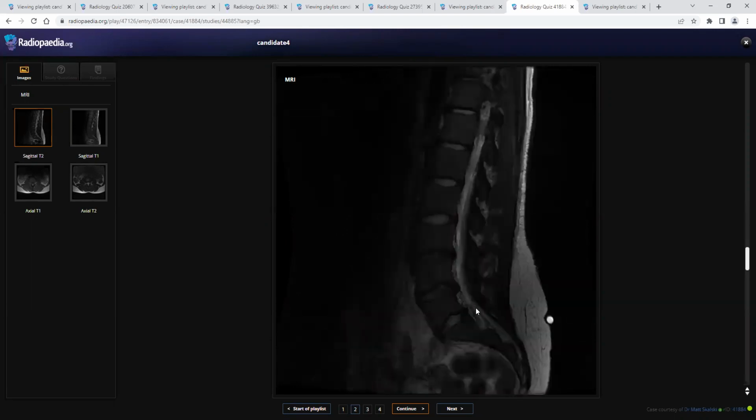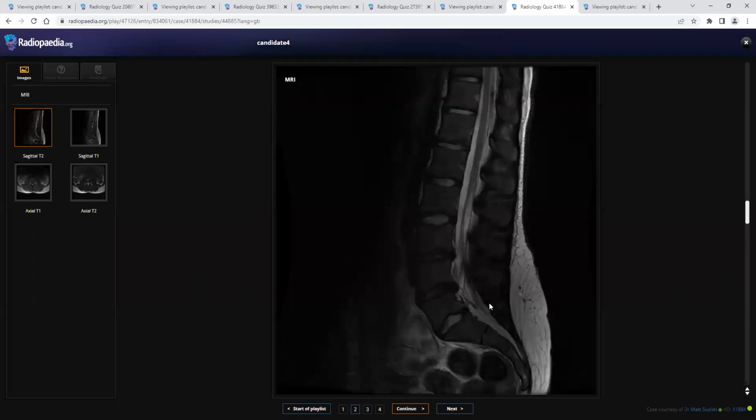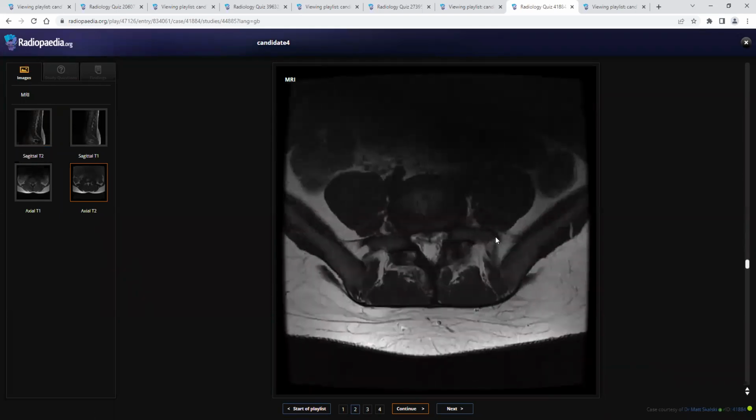Okay. Tethered cord, and I don't see any lipomatous component here to think of any lipomyelocele. Okay. On the X-ray you told something about the sacrum. Sacrum, yeah. I told it was not seen, but here in this MRI view I can make out the sacrum. Sacrum is seen, and I would like to see any bony defect in the spinal canal. I would like to see the axial views once. Yeah, there are many other sequences. You can take the... So I'm going down.